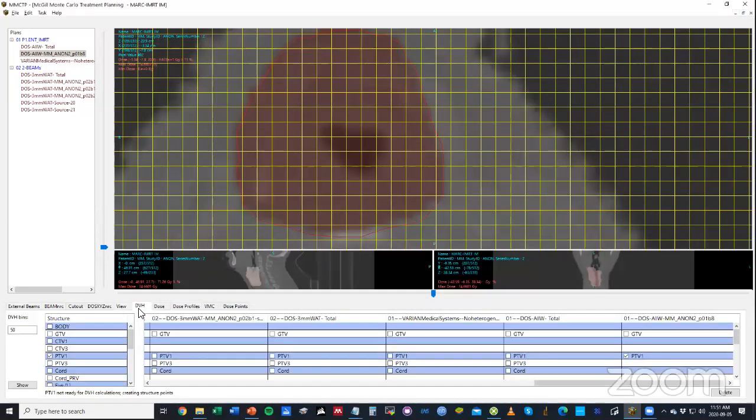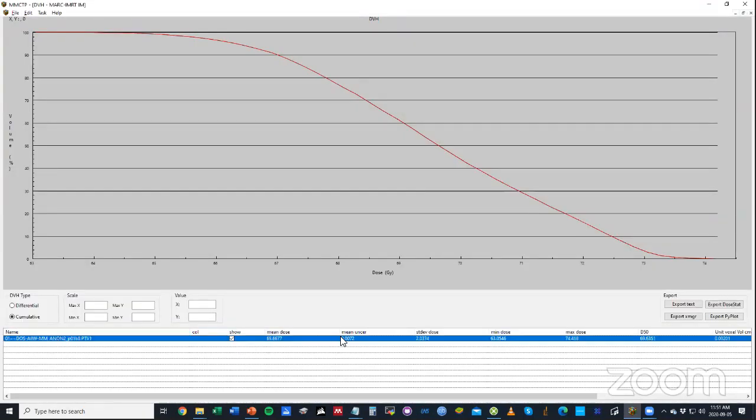And if we look back at this DVH, you'll see some statistics here. So we have the total volume of this structure using the integers. So counting all of those integer values at a very specific size per pixel to get us a voxel size, this gives us one geometric volume.